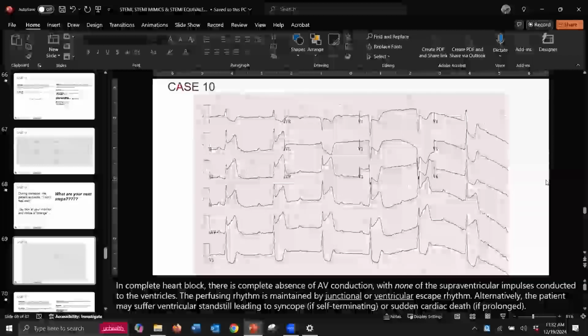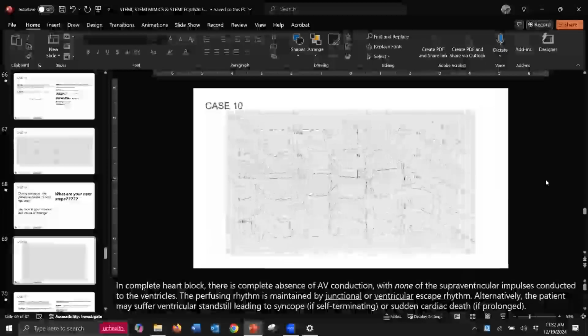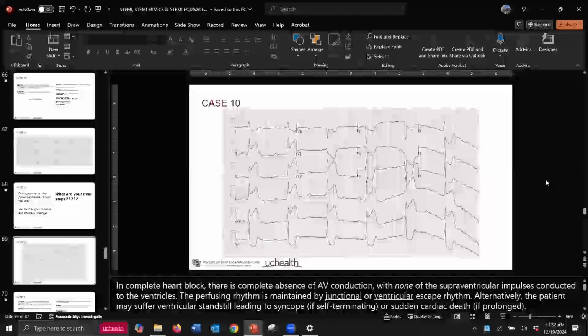Are you wrong at doing atropine while you're getting the pads on? Probably not. Does she need pacing? Yep. Ride the Edison wave. Yeah, atropine, if you've got it right with you. Yeah, okay, so she needs pacing.